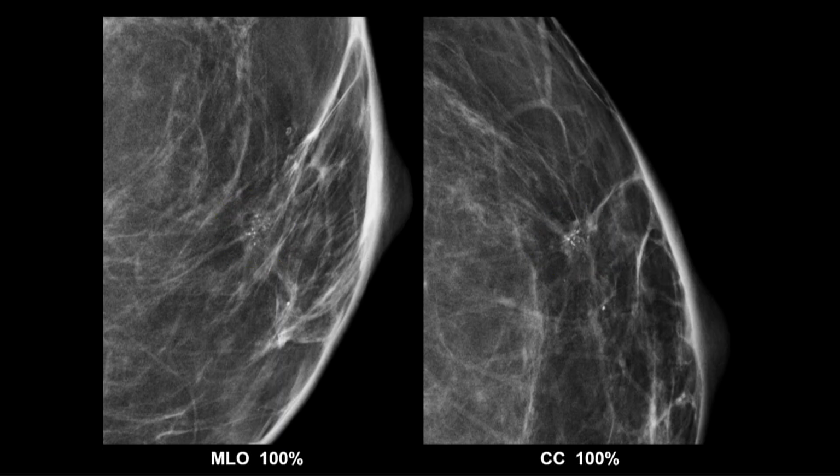So, if you know there are priors and you're contemplating a recall, and you don't have those priors, one of the things that I strongly recommend is that when you're recommending the recall, your first sentence in the management recommendations be this: comparison with previous examinations may avert recall. We have a macro built into our reporting system, so whenever this comes up, and it doesn't come up that infrequently, comparison with previous examinations may avert recall.